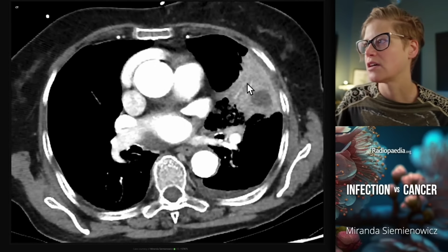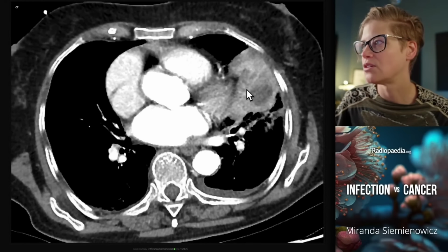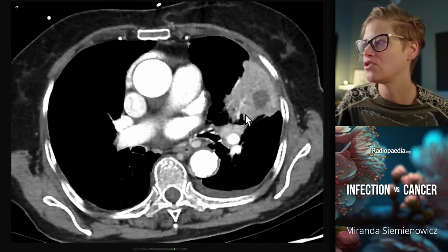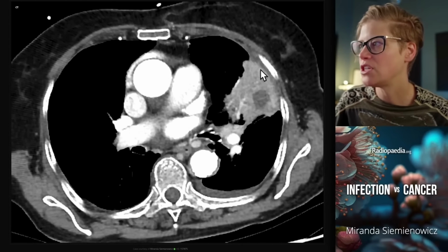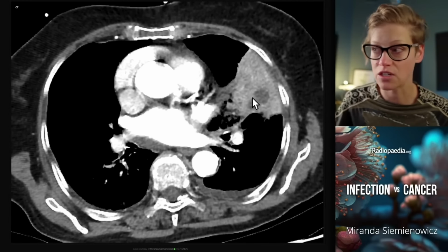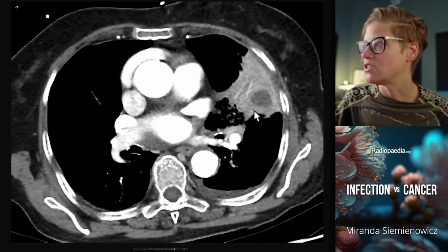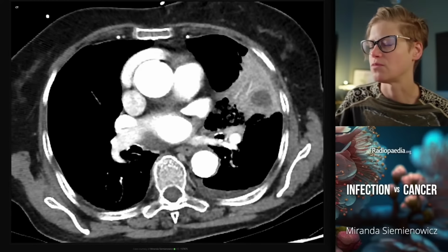And here they are, a couple of parallel vessels, a branch here, and when I scroll all the way down, I'm still seeing those all the way down here. So this is all vessels accounted for in this homogeneously enhancing consolidated lung, benign infection. Here, a well-defined low density region that is the abscess associated with this pneumonia. There's also a small paraneumonic effusion.